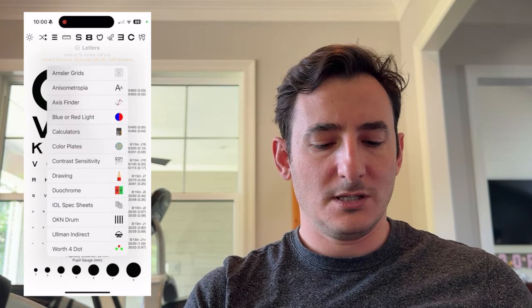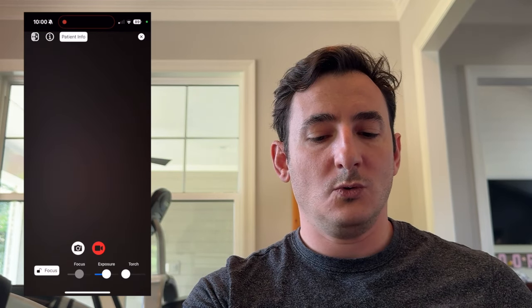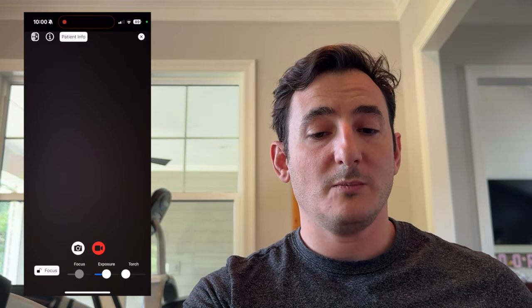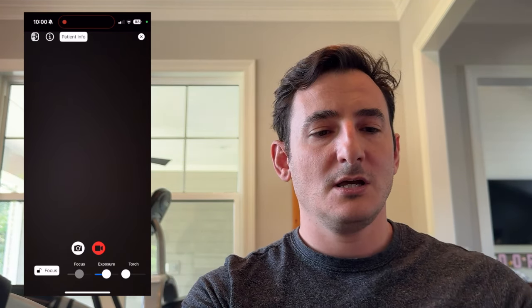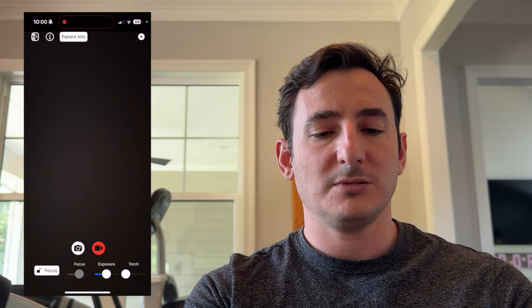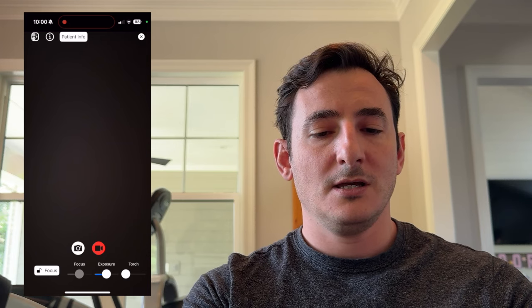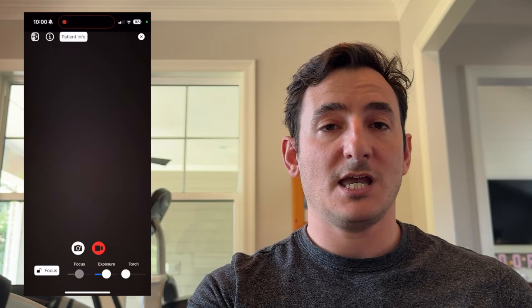Next up is the Ullman Indirect. I think this tool could deserve its own video, and if you type in smartphone fundoscopy or Ullman Indirect into YouTube, you'll see tutorials on how to use this. But let's just quickly go over some of the features here. So in the top left, you'll see that camera button. So this will switch and toggle between all the various front-facing cameras of your phone.